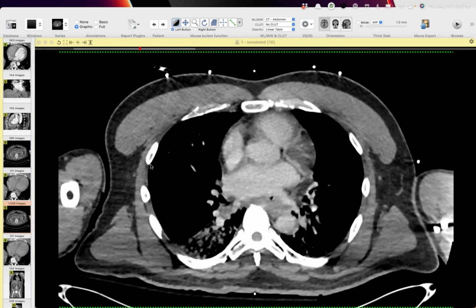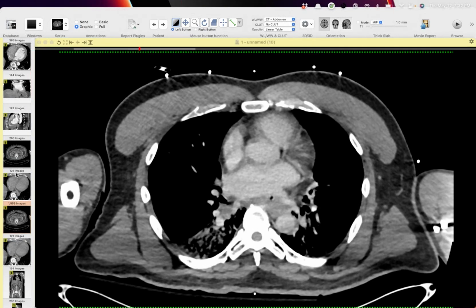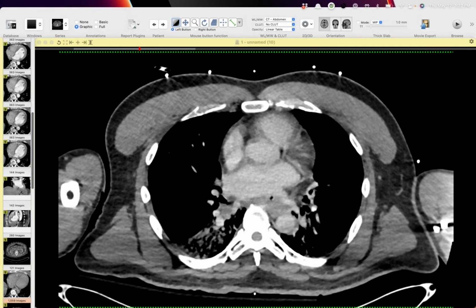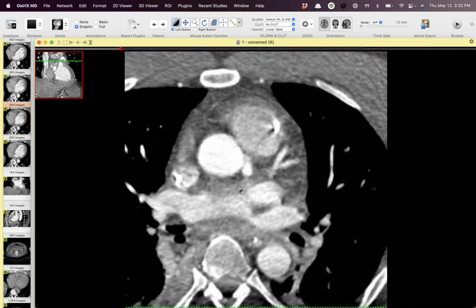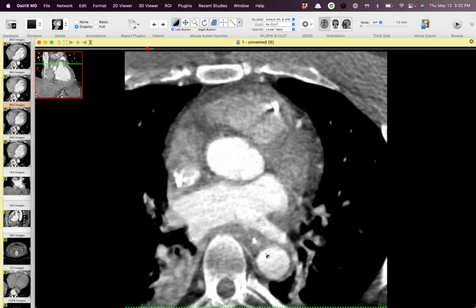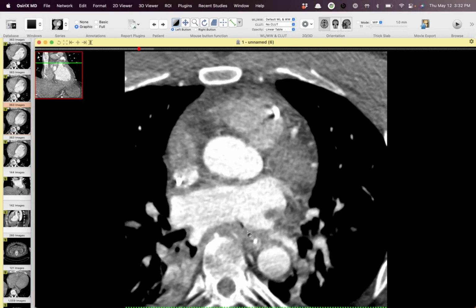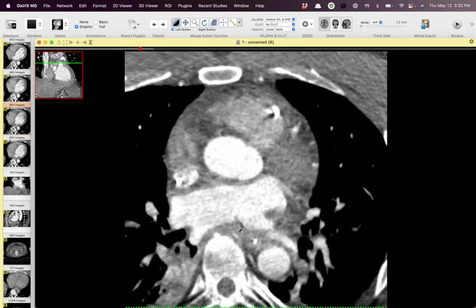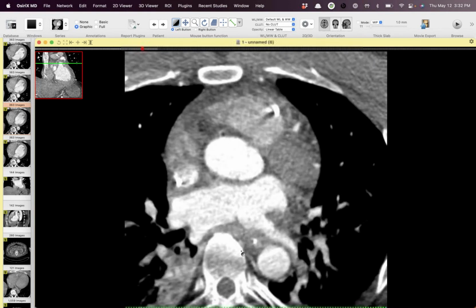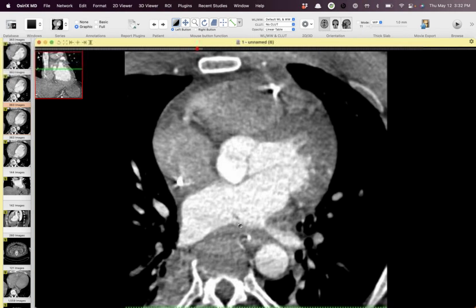But between the two of those, they came down hard that this was an atrioesophageal fistula. Now, this happens in a lot of cases because I've seen many instances of this where it's so rare that I think surgeons are hesitant to believe, so they shortly thereafter did a gated cardiac CT. You can see they've got a PA catheter in now, and here you can see that little focus of air, and there's also this little string extending into the lumen of the left atrium. I know Howard and I have both shown cases similar to this, and so there's a little bit of thrombus or whatever from his esophagus extending into the left atrium there.